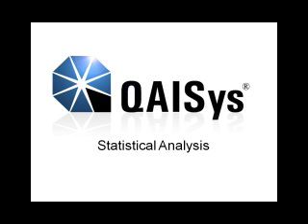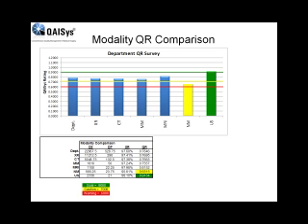The QAISys process creates a very rich data environment. It enables us to look at the data in a number of useful ways. We will briefly run through a few examples of how the data can be used. The system allows for broad surveying of ratings such as this QR comparison by modality.